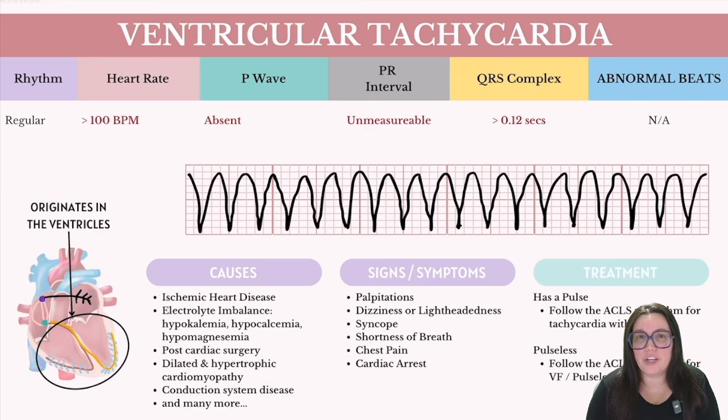The biggest thing I want to note here is that not every patient that has ventricular tachycardia is in a lethal rhythm. There are some patients that kind of just live within this rhythm. So you may be taking care of a patient and they're sitting in their bed playing on their phone, and they could go in and out of this rhythm. Unfortunately, sometimes that's normal.